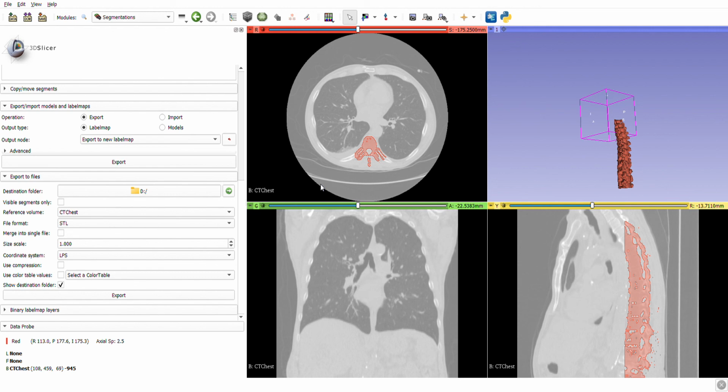To summarize, this is a medical application of 3D printing, wherein we have a 2D scan or a 2D image of the body part or the organ, which a particular doctor is looking to study, or is going to treat a particular patient with respect to a particular organ or body part. In order to make this easier, with the latest technology, we go for 3D printing of that particular organ or body part. And in order to get it 3D printed, you require a 3D model, and in order to get that 3D model from the 2D scan, we are using this software.